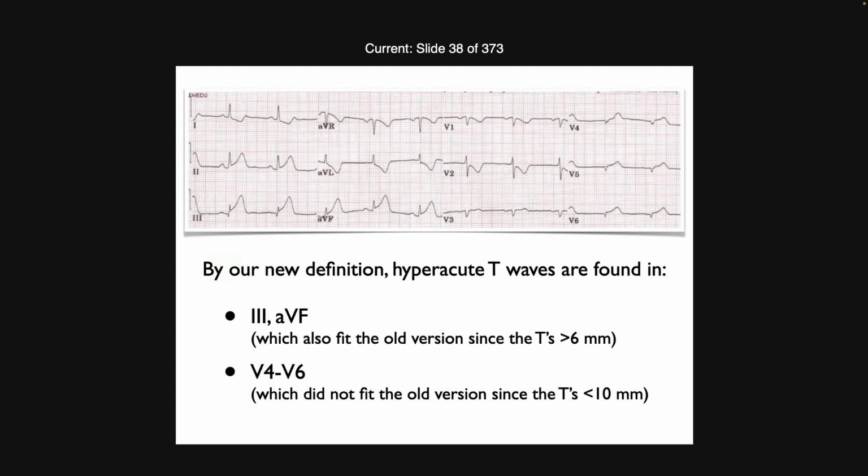So I think we don't quite have a lateral STEMI, but based on this, remember hyperacute is early, okay? And so if you look at those lateral leads, that's a very good indication that the lateral STEMI is developing, okay? Is this enough by itself for cath lab criteria? Probably not.